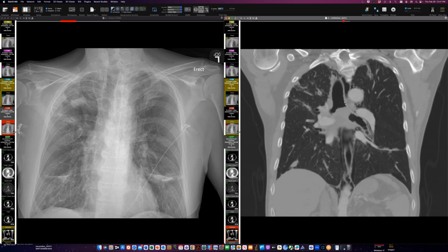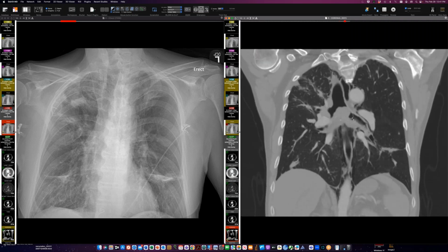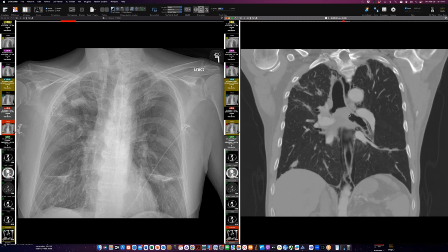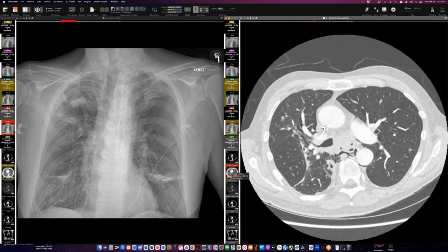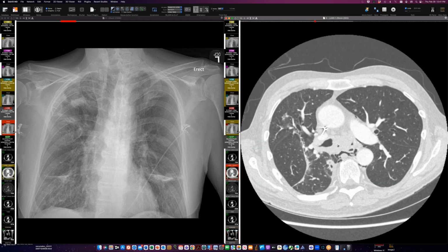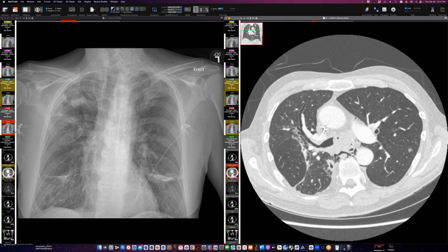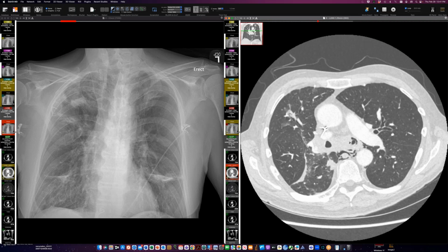This person, when they bronched this person, they found that there was obstruction of this left bronchus by this tumor mass. So this lesion in the airway is so big that it was actually sort of blown by. When you're scrolling through you think, well, this is just carina or something like that. Then you realize that this is really a huge mass here involving the airway and pretty much occluding the left airway.